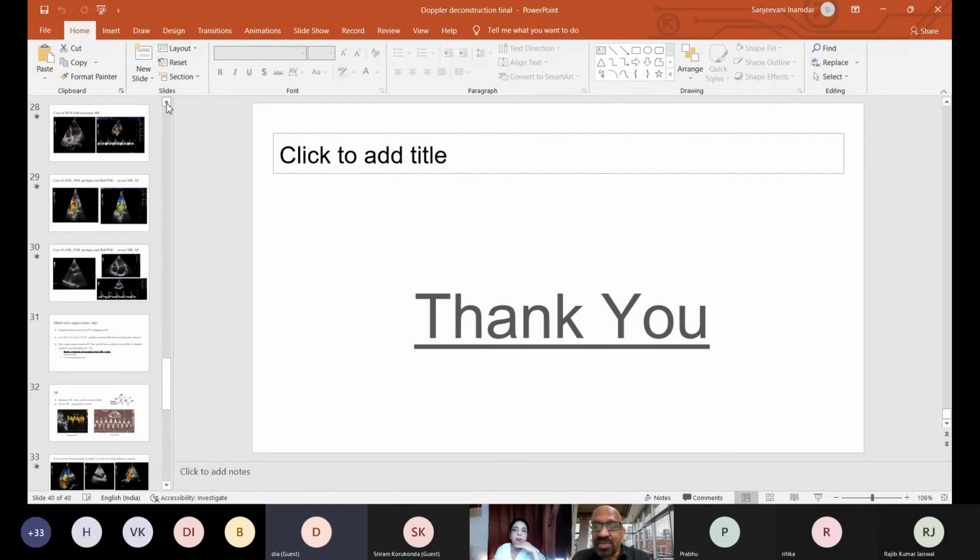But the current understanding is that portal vein pulsatility is indicative of RV failure. They are coming with this concept and going back and back, because these veins are very thin walled and connected to a low pressure chamber on the right side, that is the RA, RV and pulmonary circulation. So they are in communication, and because it is a small tube, it would show better velocity profiles than a chamber.